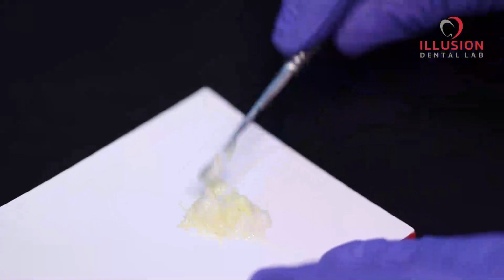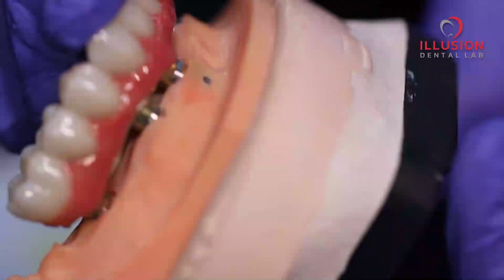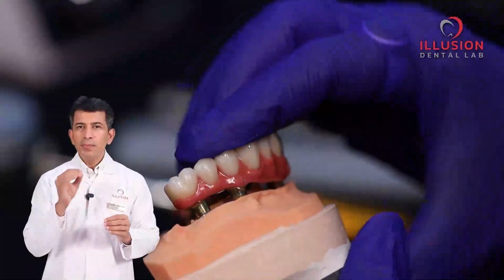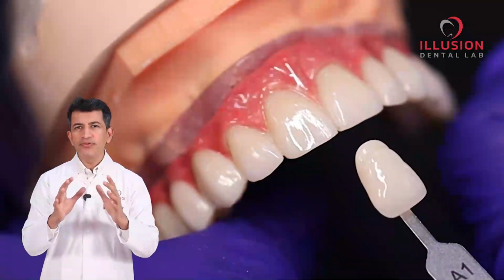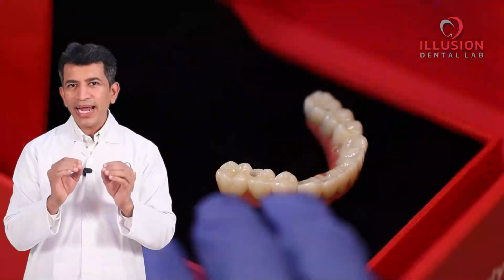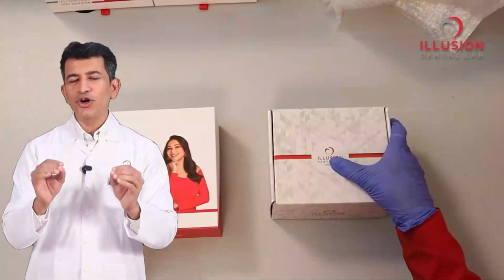The zirconia superstructure is then bonded to the iBAR using a resin cement. Final checks are performed to ensure passive fit, perfect occlusion and beautiful aesthetics. Finally, the prosthesis is carefully packed and dispatched to the dentist with complete case documentation.